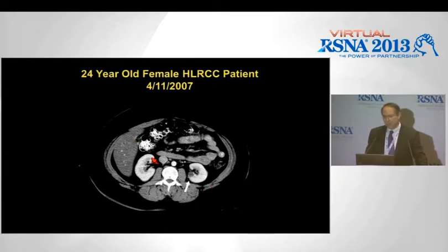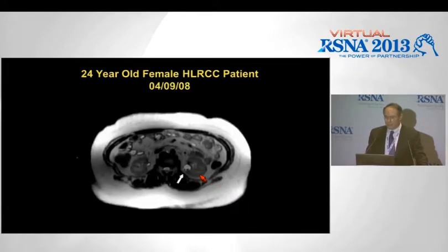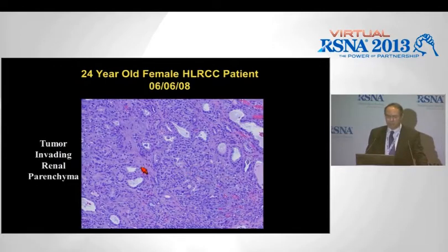So this is a 24-year-old from a family, and there was a cystic lesion. I think you might perceive a little nodule, easier to see on the MRI. And then a year later, there are 2 little nodules. It's a little bit bigger. I mean, it's a cystic lesion with a little nodule. She's from a family like this, so we operate.